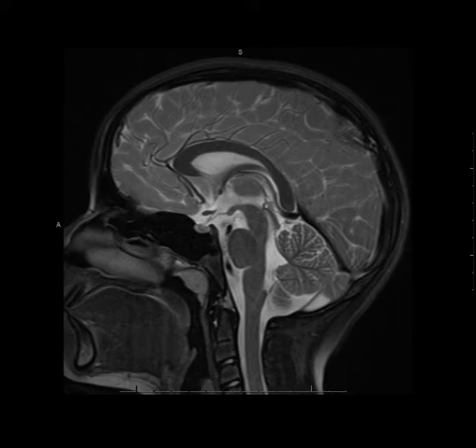First thing I think that you should take note of is that this is a T2 weighted image. CSF is quite bright and the white matter is quite dark, especially the corpus callosum there in the middle of the screen. You'll see a lot of dark signal in the blood vessels, both in the arteries and the veins, that we'll talk about later.